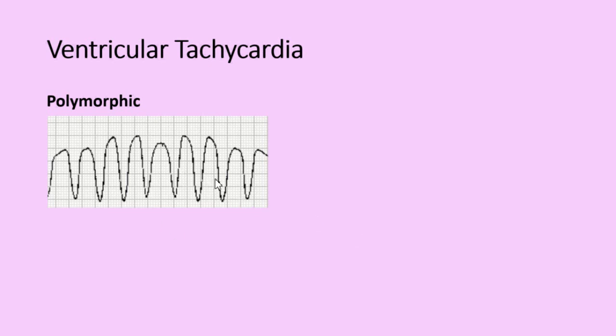And this example here is actually torsade de pointes, or twisting of the points. So it looks like a ribbon that is twisting around a central line here and just going back and forth. Torsade de pointes commonly arises in patients who have prolonged QT intervals and is a very serious arrhythmia because it can eventually lead to ventricular fibrillation.